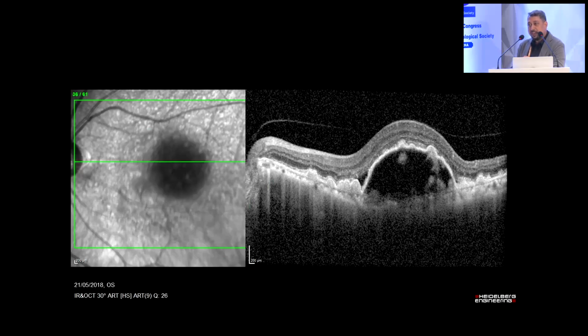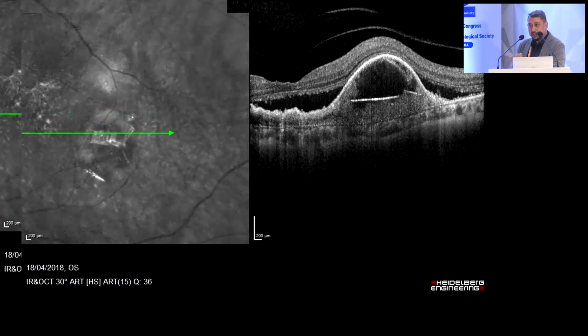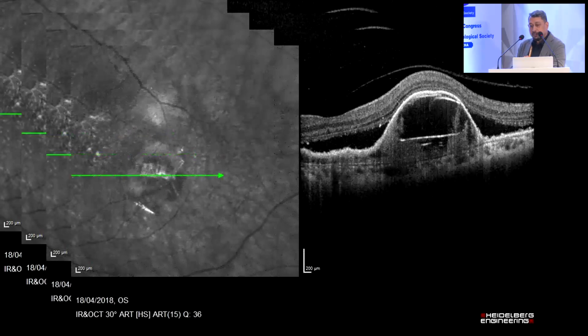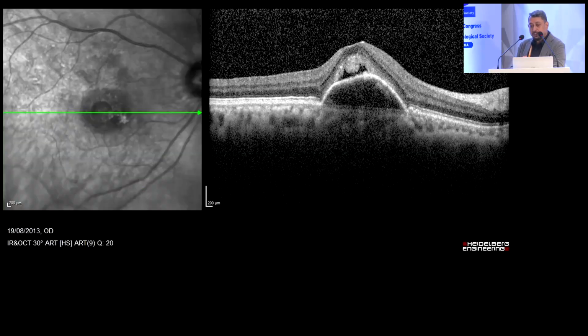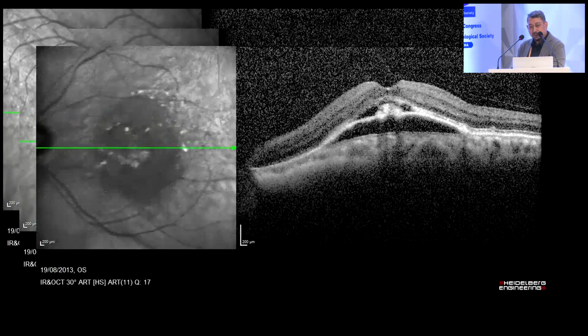These are fibrovascular PEDs, where you see the vascular tissue right under the surface of the PEDs. This is called a multi-layered PED, where you see lamellae inside. It's considered a good prognostic feature nowadays. And these are the lamellae you see inside the PEDs, which are fibrosing effects. Again, this could be suggestive of a RAP lesion, where you see fibrovascular tissue underneath it and a small amount of SRF above it.